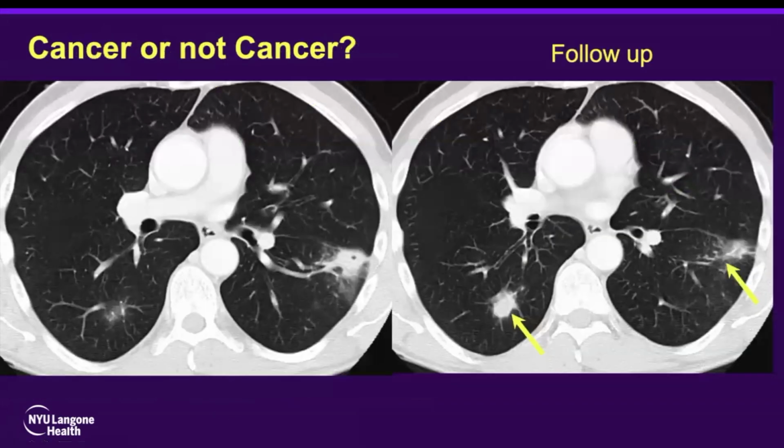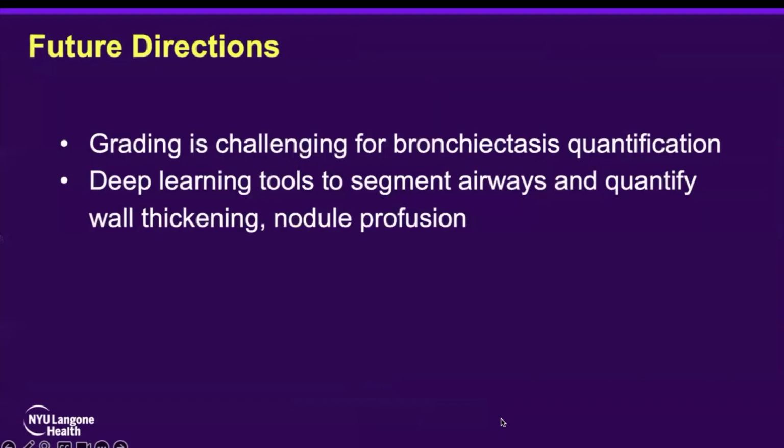Here is a colored case in which we see a sizable nodule in the left lower lobe that has a worrisome appearance with the ground glass. This indeed was followed up and shown to decrease, whereas another finding increased. This is the waxing and waning findings of nontuberculous mycobacteria. And this new or increasing solid nodule was actually followed up and confirmed to decrease and was nontuberculous mycobacteria. So just exemplifying the challenge of imaging in patients with these diseases.